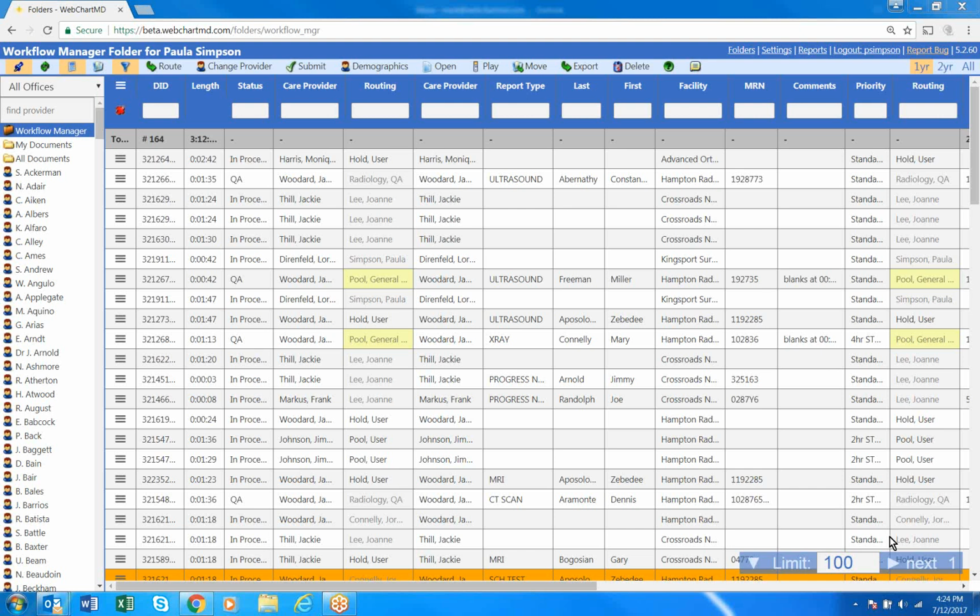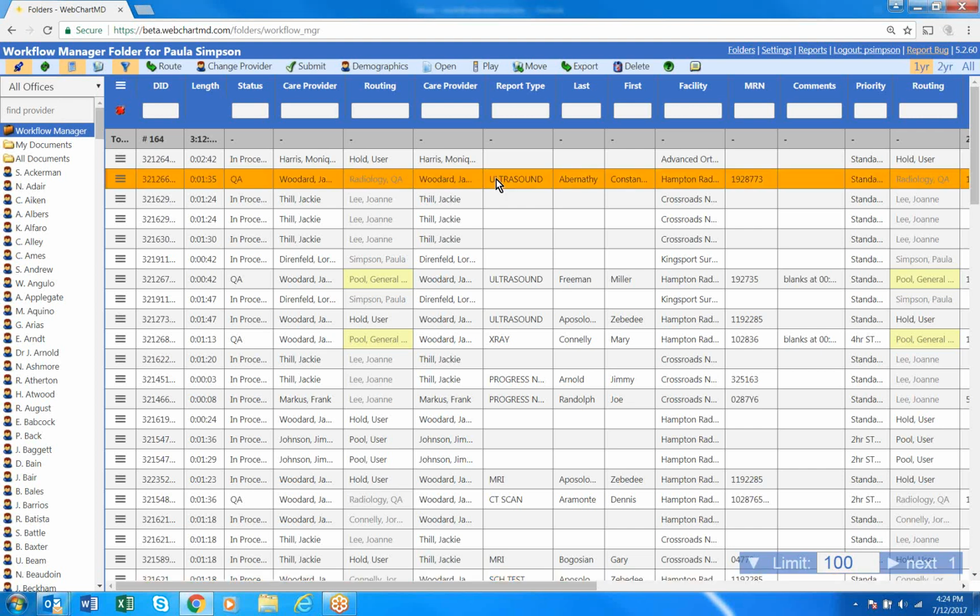We're going to take a quick look at the report type feature that we've modified and enhanced in the application in preparation for moving toward a more structured data approach on our system, and also as we prepare to move towards our low-cost, more user-friendly speech recognition application. So let's take a quick look at how the report types are now changed in the system.